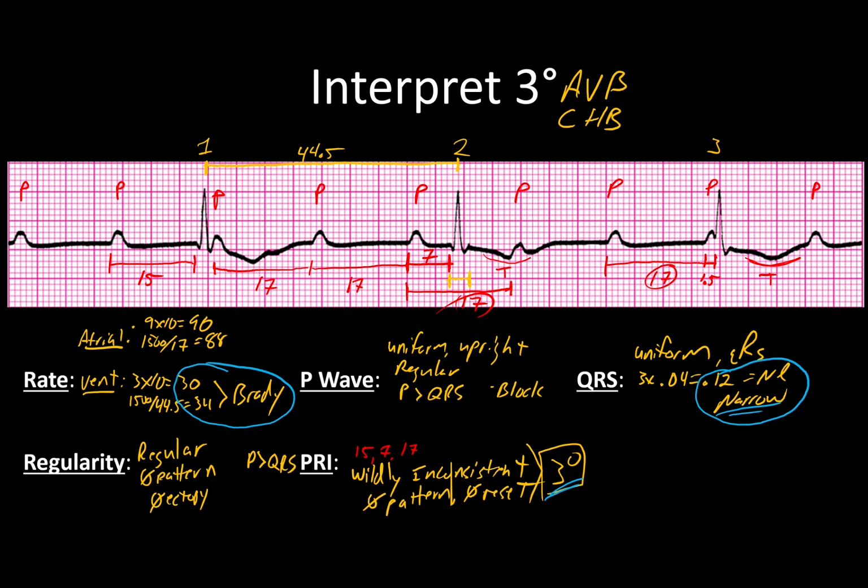You may be wondering why now this is like the third or fourth one in a row that has junctional escape. The answer is, the truth of the matter is that it is the more likely scenario of you actually seeing one of these patients live long enough to make it into your hospital. If you're going to see a ventricular escape, either they're really, really lucky, or they've wound up evolving in front of you, and you're watching that heart actually get worse to the point where it's a ventricular escape instead.